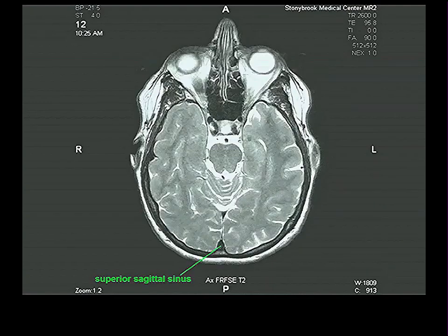Coming up again. And now we can tell, again, that we have T2 because the vitreous is bright white in a T2. We'll see a T1 later. The vitreous will be gray or black. Superior sagittal sinus, flowing blood is dark in both of them unless you do a magnetic resonance angiogram. Coming up, section thickness is greater in MR, at least in the MRs done currently. They may eventually improve it, but section thickness is greater, so you move in bigger chunks at a time.